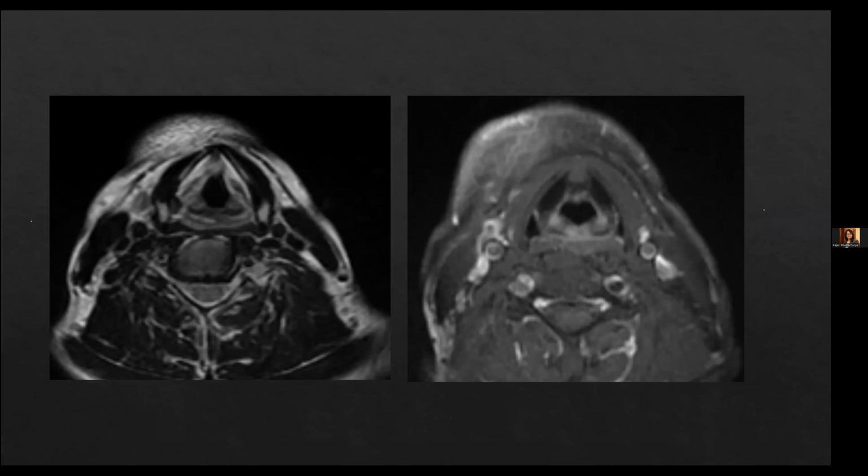On the contrary, if we are looking at the thyroid cartilage and it shows sclerosis, we should be a little bit careful in calling it involvement, because generally what happens is when there is a tumor inside or outside, the cartilage itself becomes inflamed and it shows sclerosis. Sclerosis as a reaction of inflammation secondary to the tumor is a more common phenomenon rather than the tumor actually being involved in the thyroid cartilage. So for thyroid cartilage per se, we have to be a little bit careful. Whenever we are seeing erosion or lysis, only then should we say that the cartilage is involved. If there is only sclerosis and we are not able to demonstrate any through and through extension through the cartilage itself, we should not ideally call it a cartilage involvement for thyroid cartilage.